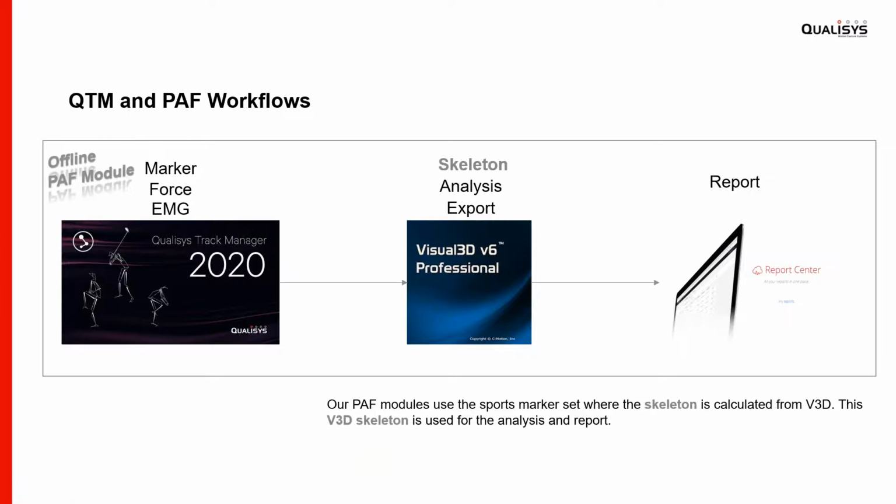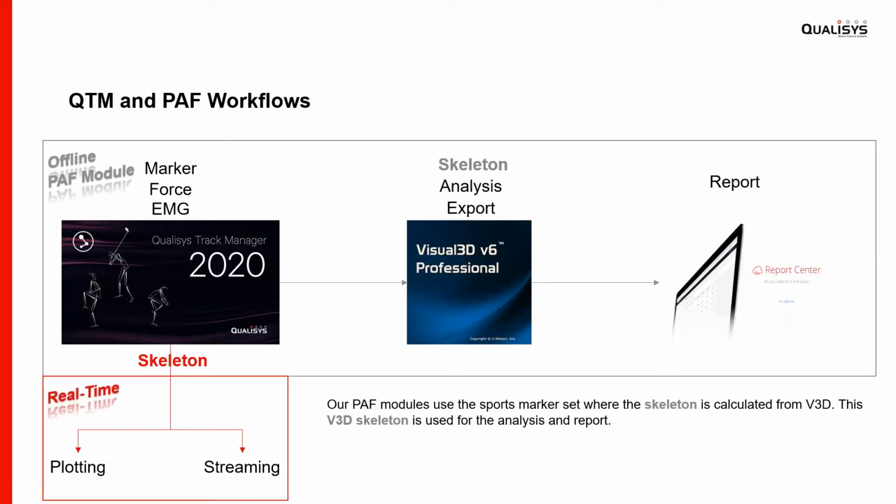And now, since 2020 and this release, with QTM we can also create a skeleton, like you just saw before, and we can use it in real time, also in file mode. We can use it for plotting some skeleton data in real time, if you're interested in that, or you can use it to stream to third-party software.